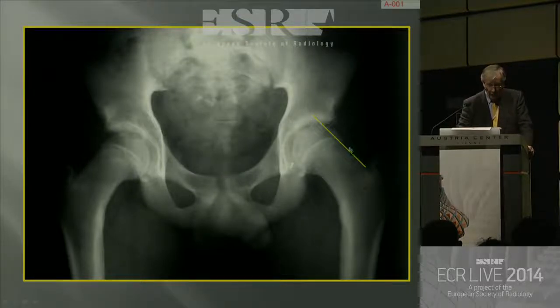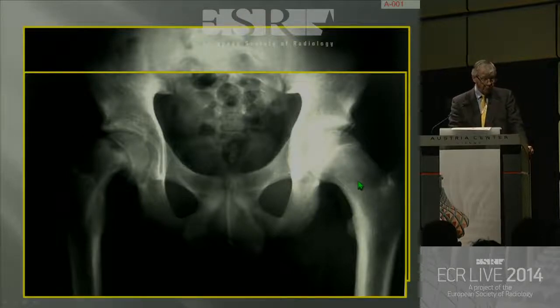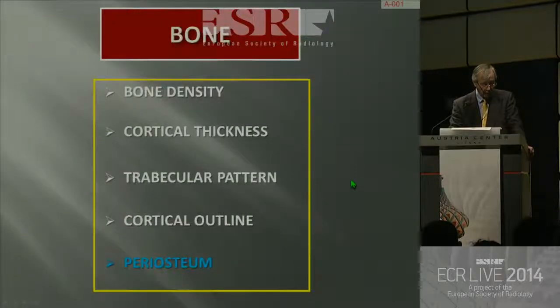There is the line on that side, and you can see there is a bit of epiphysis above the line. On this side, there is no epiphysis on the line. And this is the later film showing you the slipped femoral epiphysis. So again, outlines, very important to check, and compare with the other side.